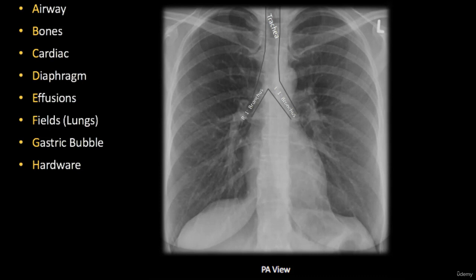The other pathology which can change the normal picture of the trachea may be the growth of a tumor or enlarged lymph nodes. If they are severely enlarged, the trachea could be pushed from the midline to the right or to the left. Same is true about the arch of the aorta. By the way, if any aneurysm or dilation of the ascending aorta or arch of the aorta is present, that may cause deviation of the trachea from the midline.